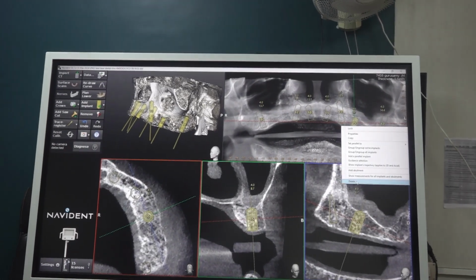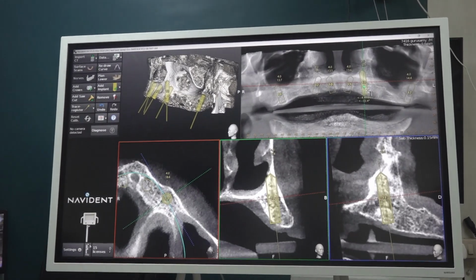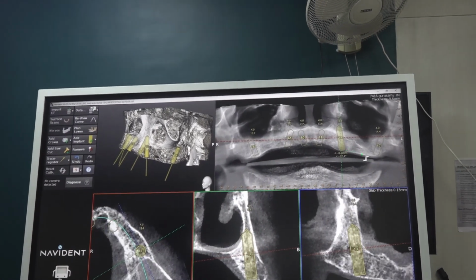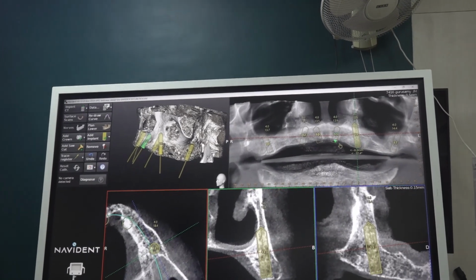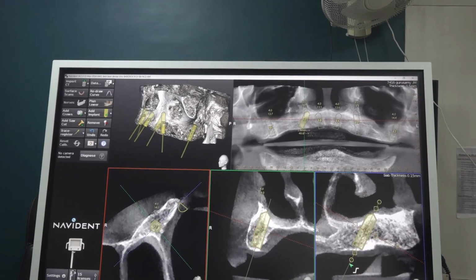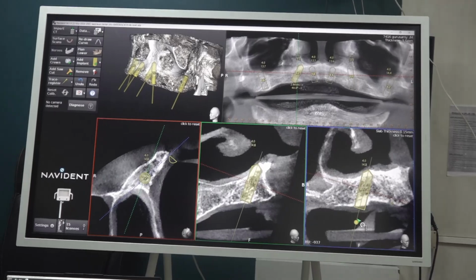We can place a second premolar implant, and to improvise the plan, what we can do is we can tilt this, we can move this implant slightly distally, because the sinus is favorable, and we are avoiding this inter implant distance, and it's a good spread rather than packing all the implants in the anterior, and we will see whether we can tilt this implant still more distally. There is no big advantage in tilting this. This is from almost second premolar. We will place from first premolar.